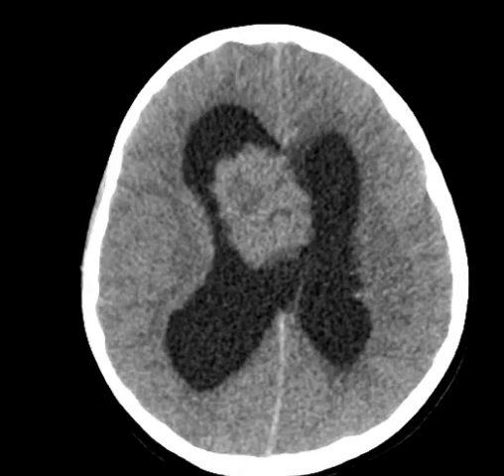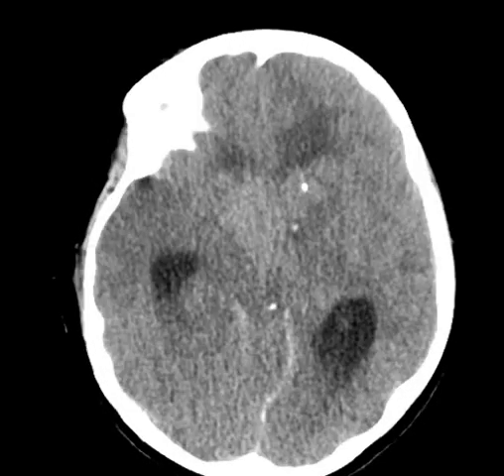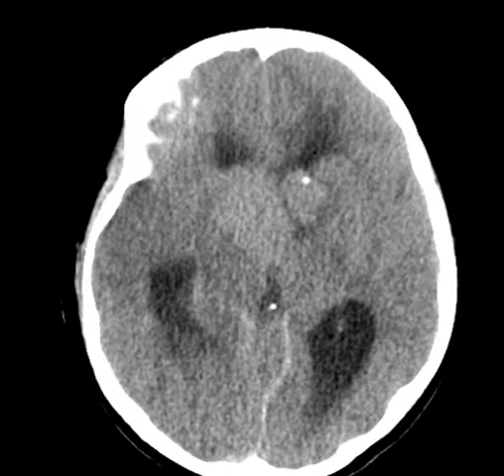We have this patient who presented to us with a history of seizures and mental retardation. A CT brain was performed, and you can appreciate a lobulated mass at the level of the frontal horn of the right lateral ventricle as well as in the frontal horn of the left lateral ventricle. This is one mass. This is the second mass.